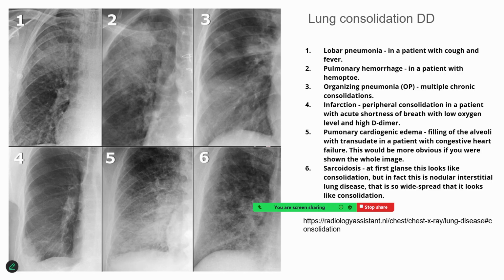So if you repeat the X-ray in some different positions, that can be made out. Moreover, the density would be more in the lower area, and towards the gravitational superior area, density becomes lesser. And the anatomical markings also may not be very clearly seen.